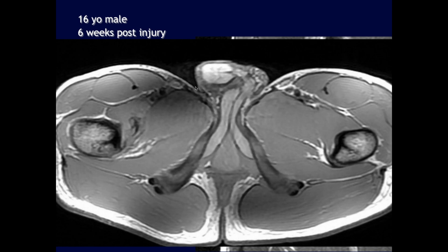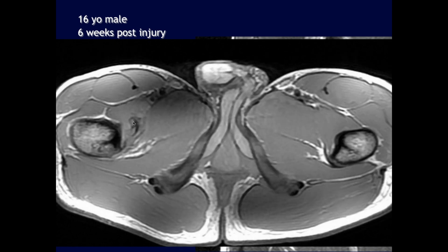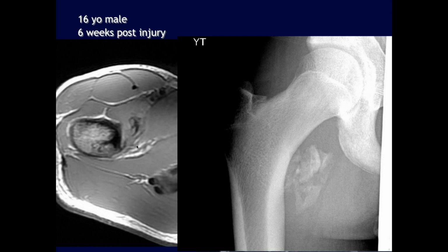Okay. So let me also go back here. I guess this could be an injury of the musculotendinous junction. So here's the myositis ossificans, okay, there's the calcification. iliopsoas tendon on each side. And if we go down here, this is what it looks like on the right. This is what it looks like on the left. Okay, so that does look like a cortical ossific avulsion fragment of the lesser trochanter. And there are the plain films.